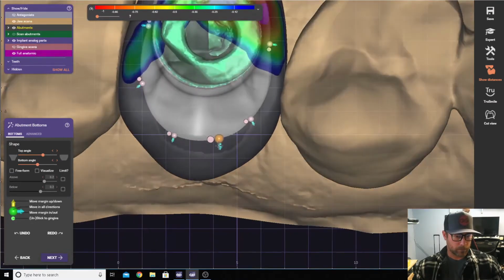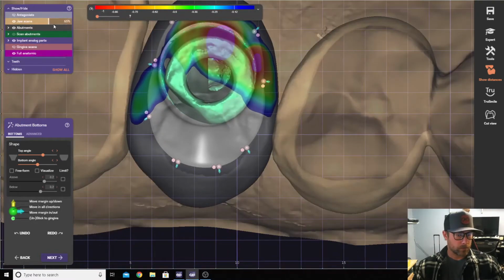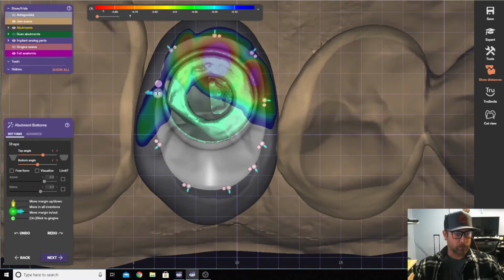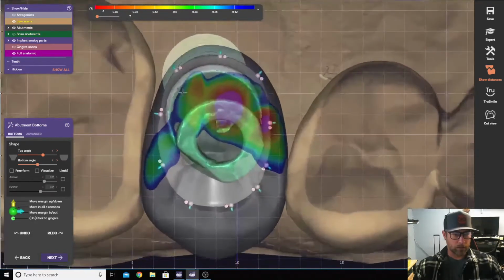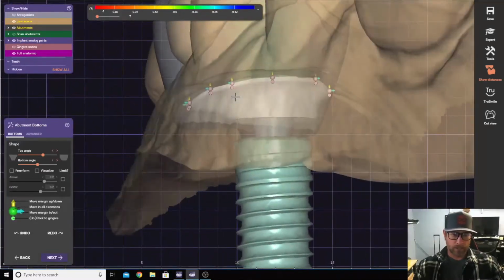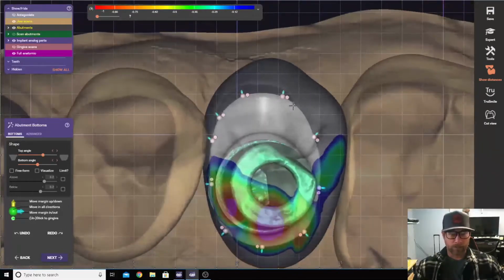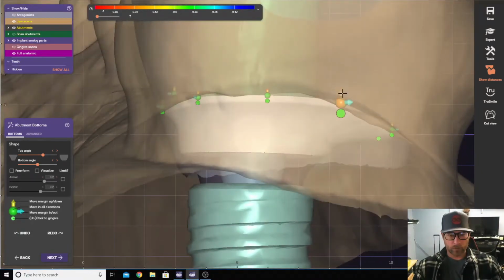Bring it back. Okay. Then sometimes, there we go. Sometimes you have to make it more translucent before it will add the point. Now I got everything the way that I want to. I want to make sure that my margin isn't all jaggedy, and it kind of does a little bit. So I always unstick everything by holding down the control button and clicking on the circle. That does all of them. So now I can manually adjust it.